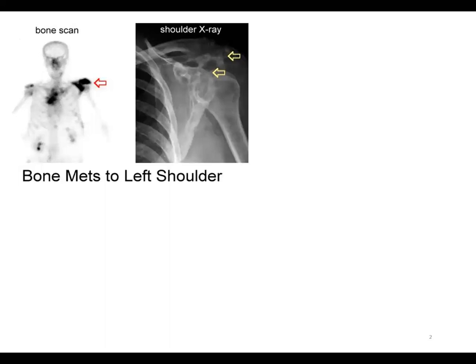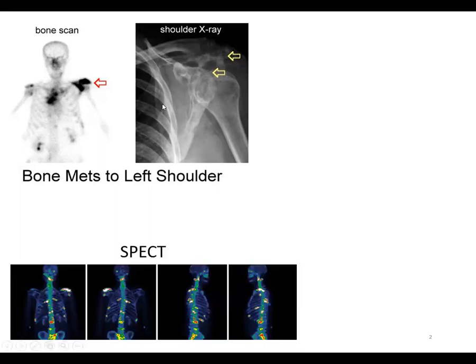On this slide, we can see a bone scan, an example of bone scintigraphy, a radionuclide method of examination. We can see increased accumulation of radiopharmaceutical in this dark region in the suspicion zone. We can see the same patient's shoulder on X-ray: the deformation, the abnormal shape, size, and contour, and radiation density of the shoulder. This is the presentation of bone metastasis of the left shoulder.